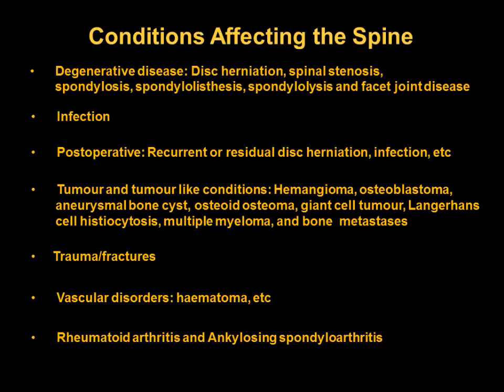If it is listhesis, then you need to show whether it's two joints. It's always two joints. So which one is anterior? If it is L4 over L5, whether it's going anterior, you say L4 over L5 anterolisthesis. Or, because L5 is posterior, you say L4 over L5 with L5 retrolisthesis. So the clinicians know what you are talking about.